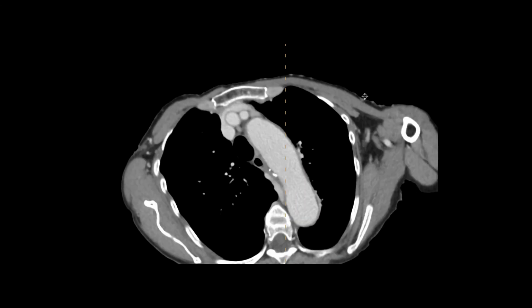Okay, great. So another example of how the radiologist works with the technologist. We figure out a way to do a study that isn't normally requested. How do we answer the clinical question? And we have a discussion about it. And this is what we do every day in our hospital. These things come up so frequently that we have to have these conversations. It's not just a routine, push the button, scan everybody at a certain phase all day long. We get these cases a lot where we have to figure something out, and we use our minds, put them together, and we come up with the best possible protocol for the patient.